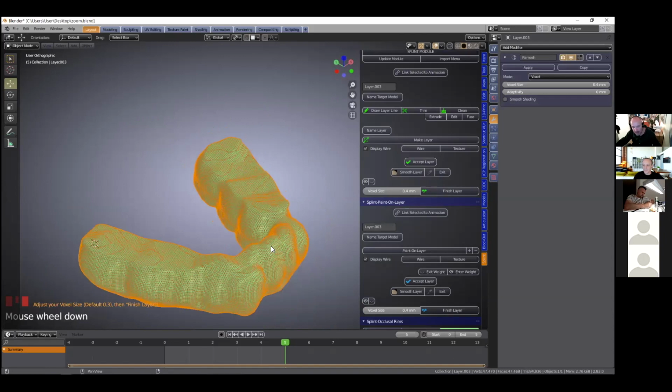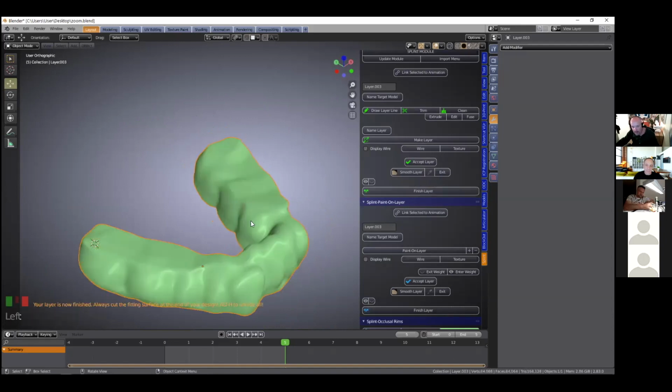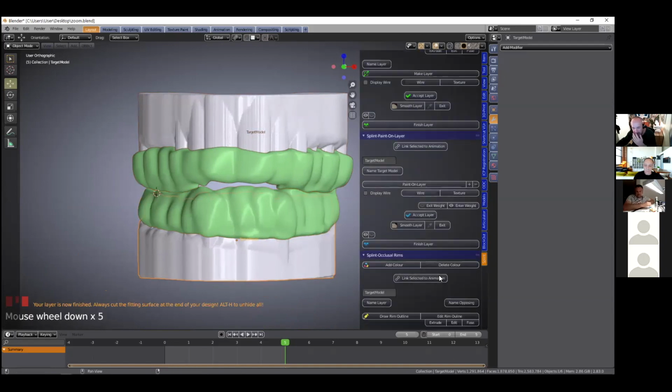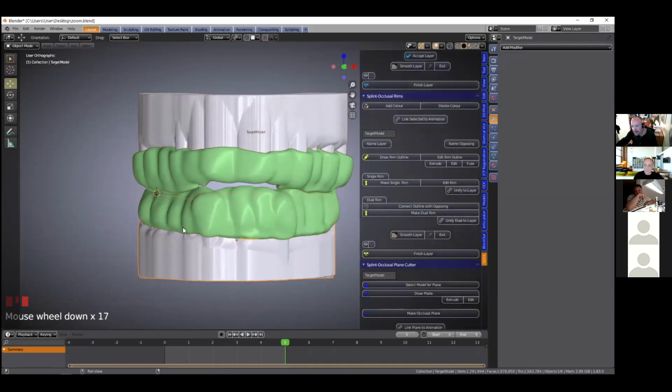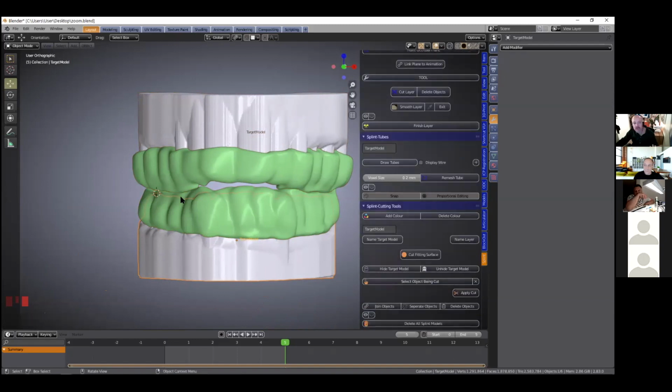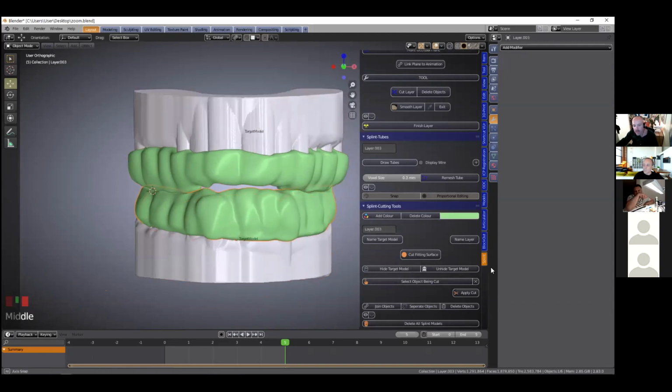And then lastly, we're going to cut these objects, and I would definitely say we're not going to use target and layer, because we've got two target models and two layer models. So in this event, I would use these here.